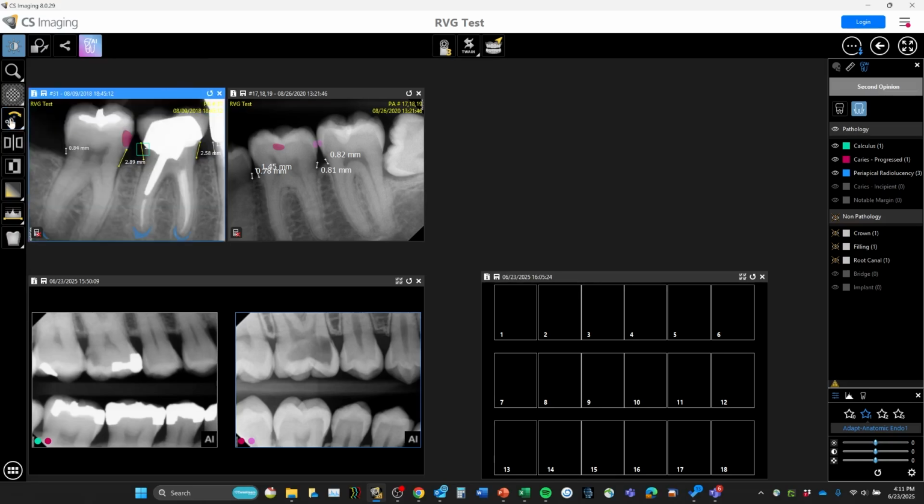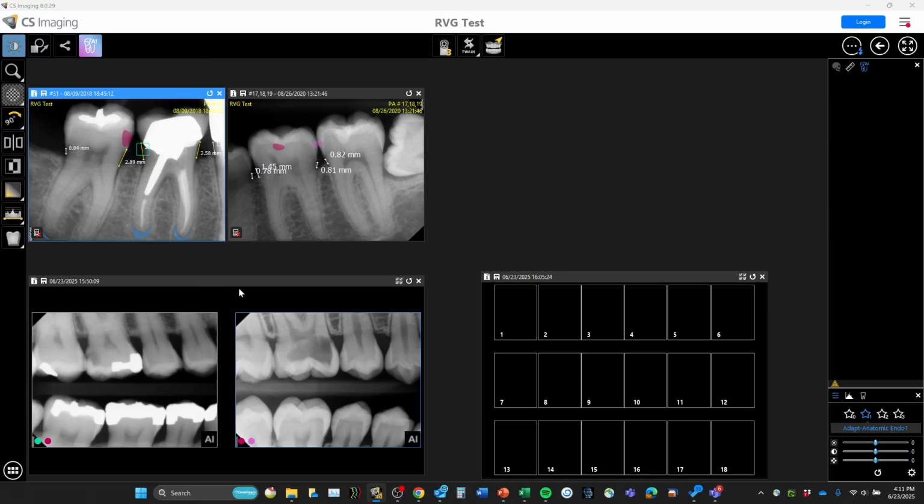The other thing that we have is when they are in formats. The FMS editor will separate these images automatically based on the tooth number. The editor allows you to separate left and right, and then upper and lower arches. But sometimes the images may get taken in the wrong order, or they are mislabeled or something like that, in which case we need to rotate some images. Maybe we don't have exactly the format that you need for the application, so you just make do with what you have instead of making a new template.